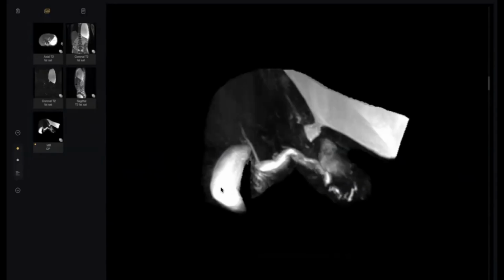What is this? The gallbladder. Excellent. And this, I think, is the duodenum. What is this? Second part of the duodenum. What is this? It's the common hepatic duct. What is this? CBD. Excellent. And this is the effusion. What is this? I think it is the stomach shadow.